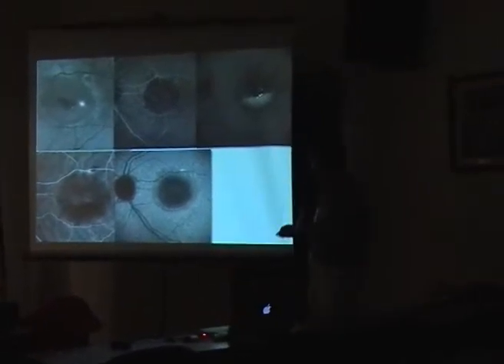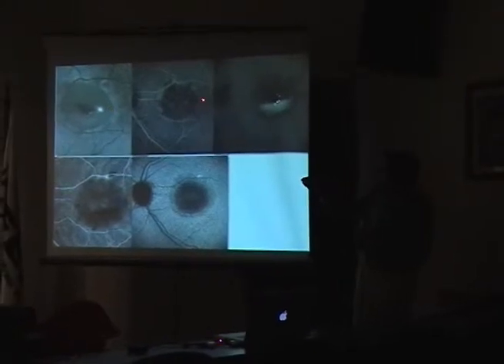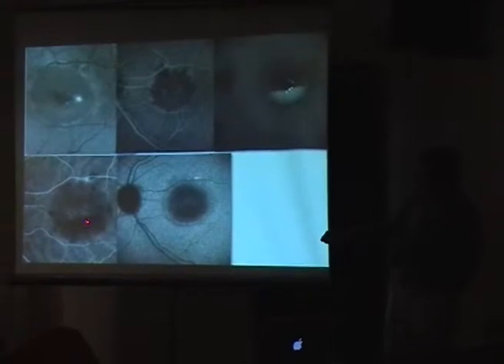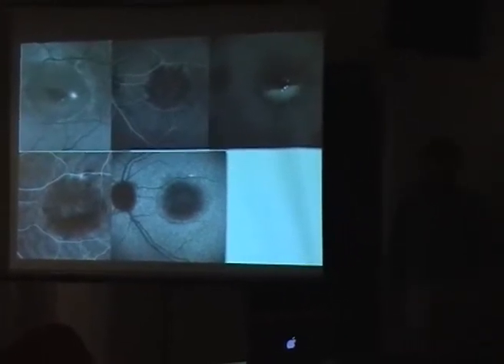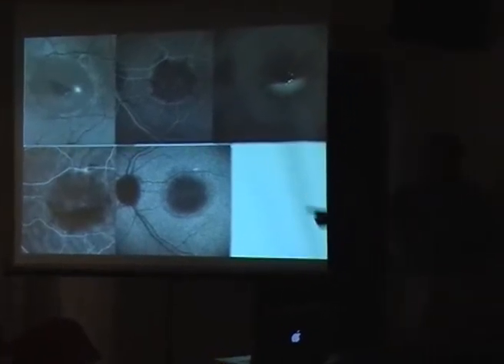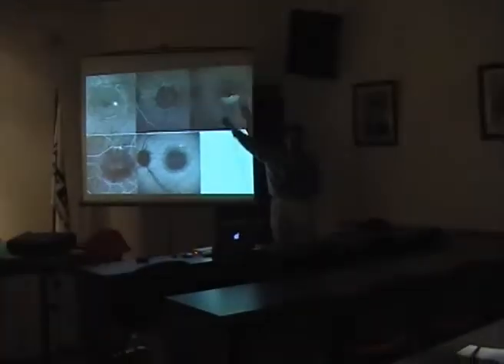And what about this case? You see red-free, fluorescein early and late, ICG early and late. It was referred to us for photodynamic therapy some years ago. What do you think is the diagnosis here? Do you think this is leakage?